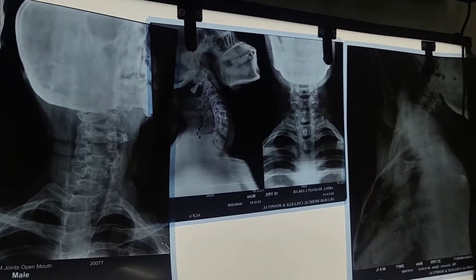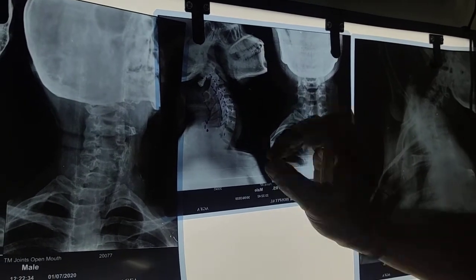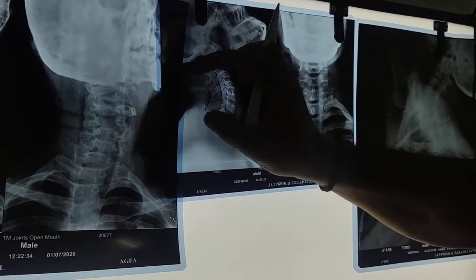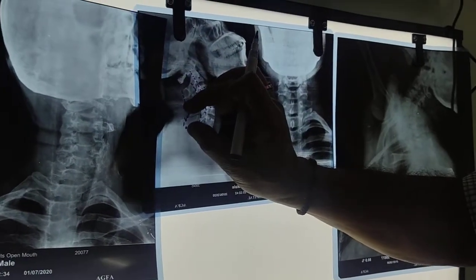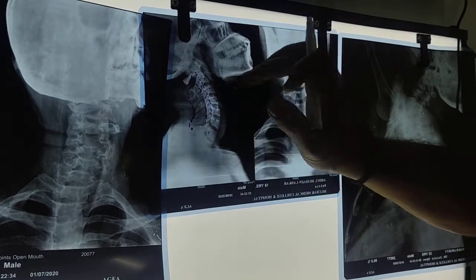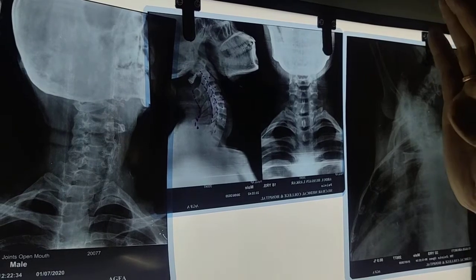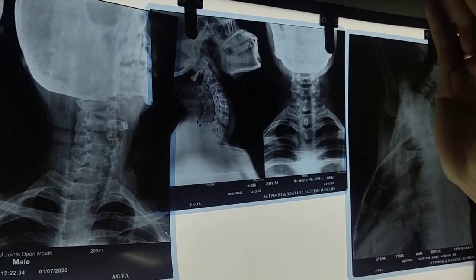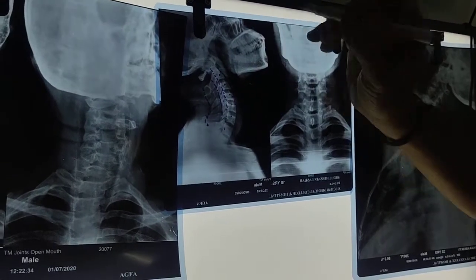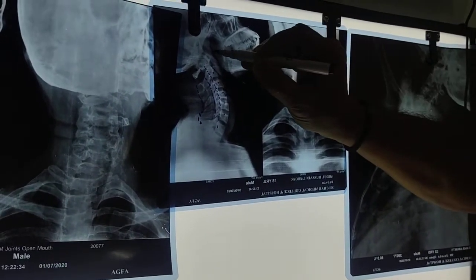There may be a shearing force at the level of the cervical disc. Anteriorly it is going down below and causing this impression here. C means your cartilage. But before that, I have to say one more point: while reading the X-ray, there is another line in the soft tissue also.